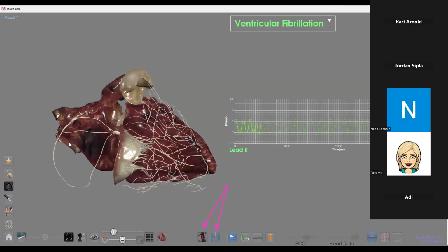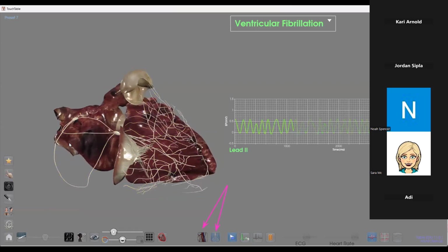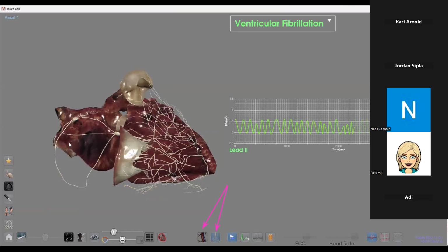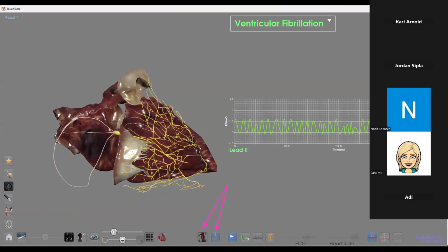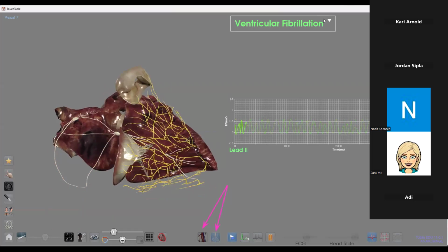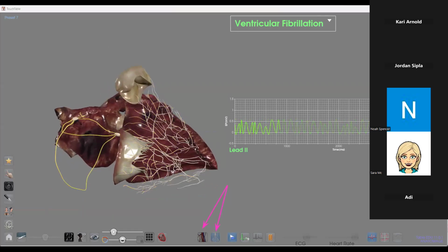If you need a little bit of a reminder on how presets work and how to export and import them, the intermediate course on our training portal on Anatomage Share walks through all of that. So that is a free training course you'll have available if you need a little bit of a revamp on how presets work. But okay, I got ahead of myself.